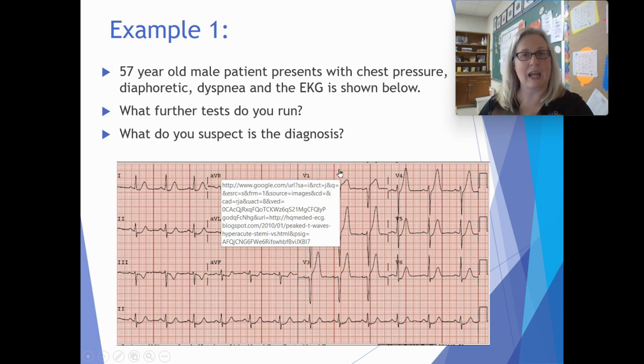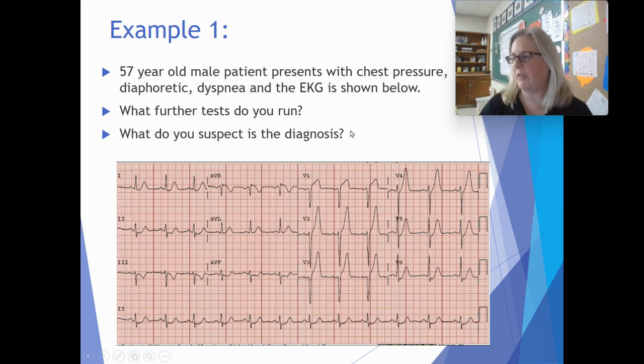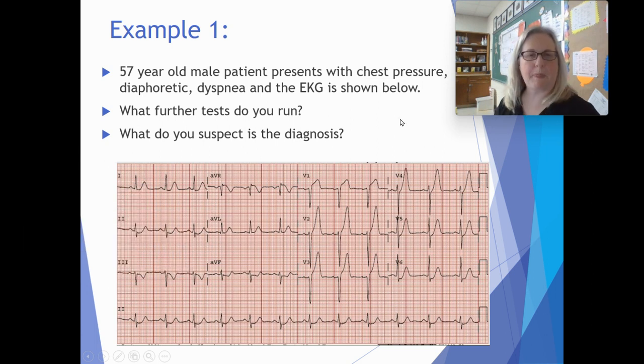So let's break it down like we've been doing. So lead 1 and AVL go together. 1 and AVL. Do I see any changes in 1 and AVL? I believe you have these in your examples too. I'm going to look at my packet while you're looking at that real quick. 1 and AVL. Yes, you do.